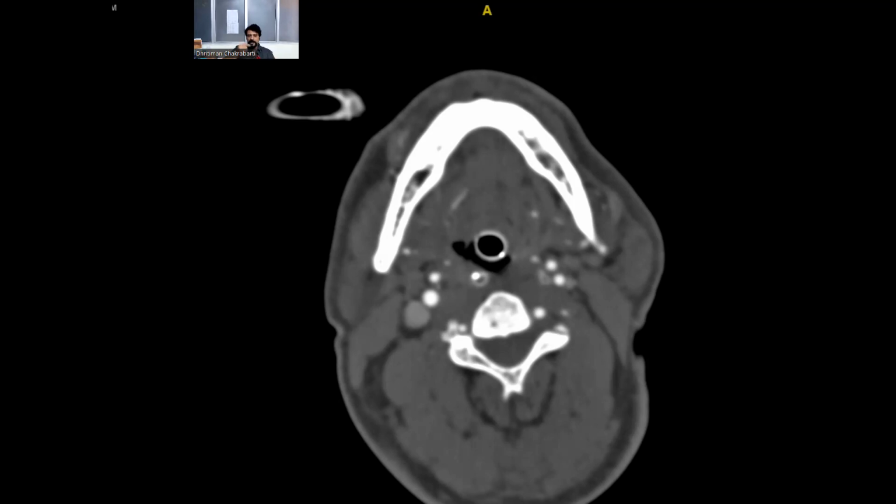This basilar will travel in front of the pons. Remember always, it will travel in front of the pons and at the level of the midbrain. The midbrain, you remember, is a butterfly-shaped structure. The middle V inside the butterfly or heart-shaped structure is known as the crura.